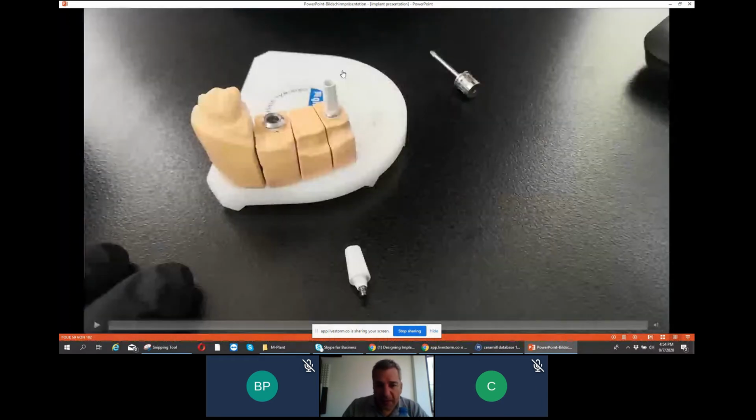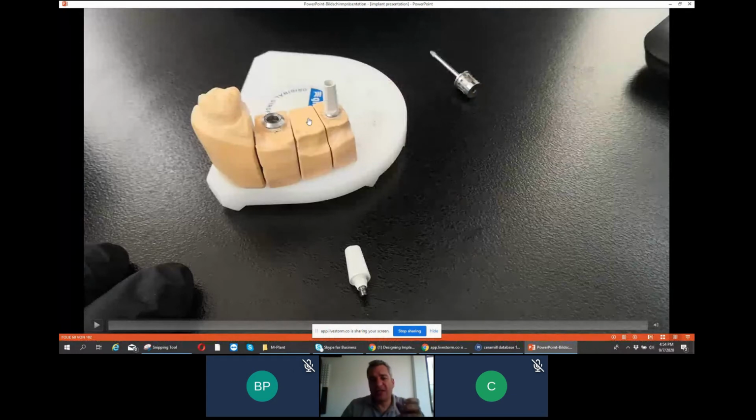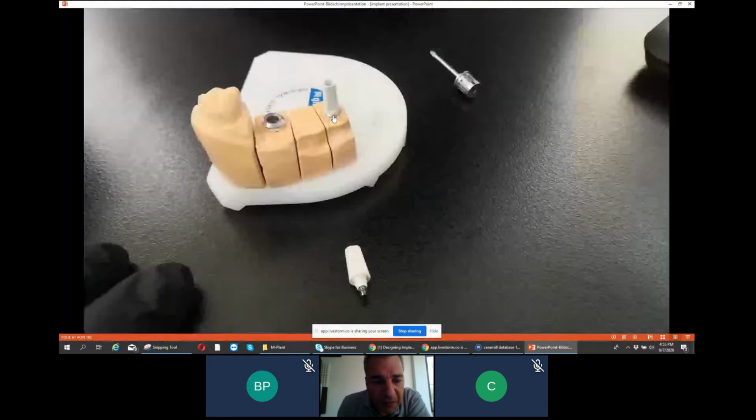Now, about the abutment plus crown, or Type 4, which is single restoration, we need a scan body with a flat surface to know the direction and the position of your restoration. And since the TiConnect will fit inside the implant, we need a scan body for each type, for each diameter. Here we have 2 implants from Straumann, one 4.8, one 6.5. So we have 2 different scan bodies. So video.